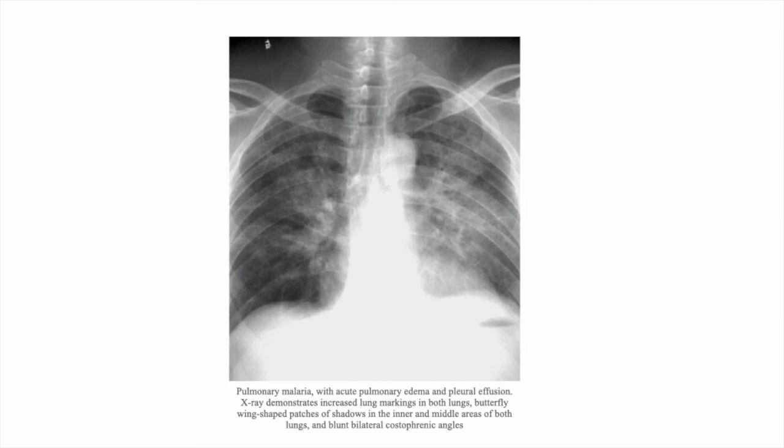In the majority of chest X-rays, you want to see increased lung markings. You also, in the majority of the cases, want to see bilateral acute pulmonary edema, with the radiological sign of bat wing or butterfly sign, which is very specific for this kind of disease, pulmonary edema. So it's the most common sign you're going to see in the chest X-ray.